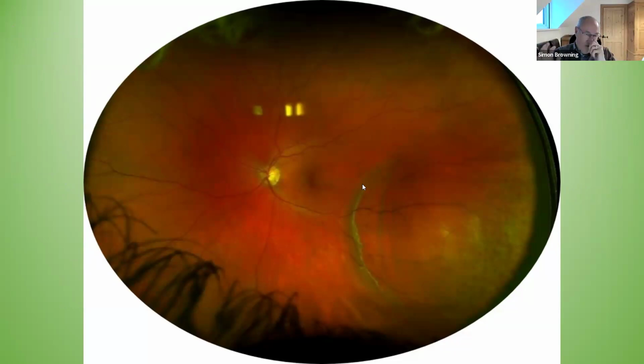Now, you could be a bit gung-ho with these patients and say, well, that's probably okay. I must admit, I think with a patient like this, it is sensible to get the opinion of your local vitreoretinal specialist and say, in my opinion, this looks like a collapsed schisis that is a stable, resealed retina, but I would value your opinion of it.